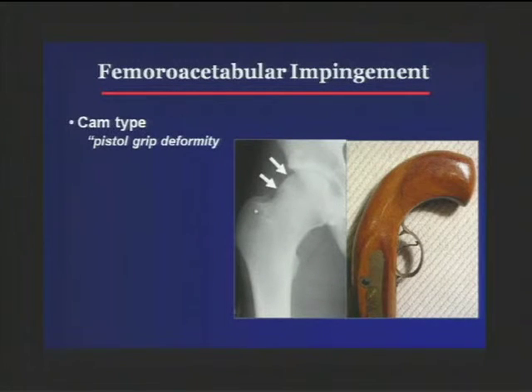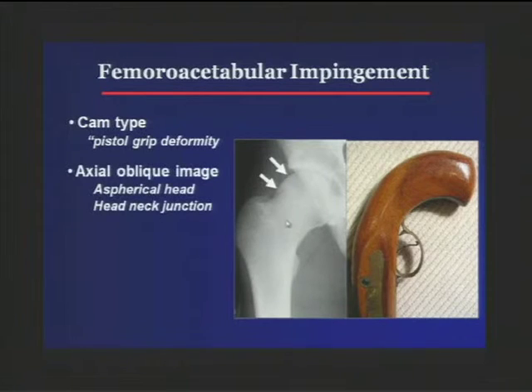deformity where you lose the concavity of the head there. That does not mean that they have femoroacetabular impingement. And what we say here is just like in the shoulder with impingement syndrome, this morphology may predispose to femoroacetabular impingement and symptoms.